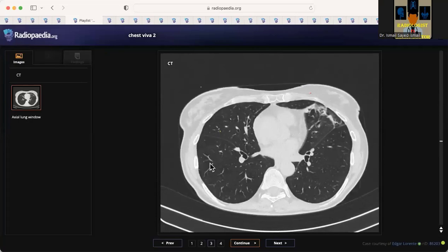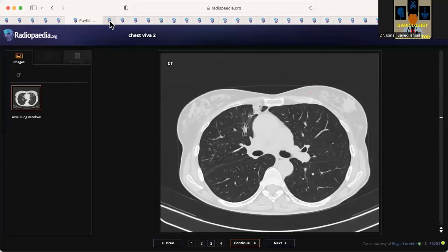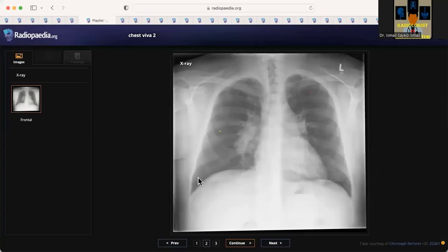So usually in elderly patients, but this is a Lady Windermere syndrome. So well done. Yeah. So next, is it candidate 3?